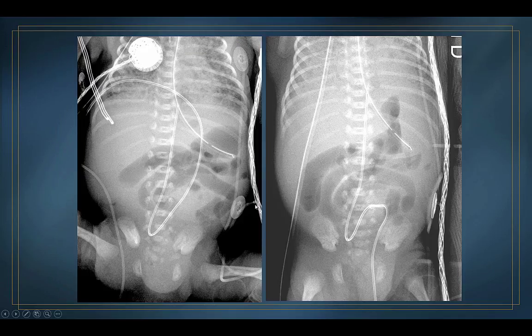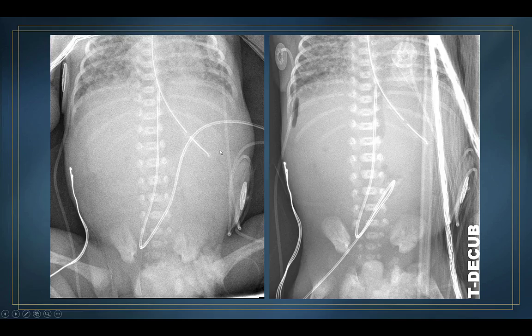Okay, this I think was a 9-day-old, 23-week-old baby that has multiple elongated loops, and most of these, if not all of them, are going to be small bowel, and that's very abnormal. And this is the baby 20 hours later.